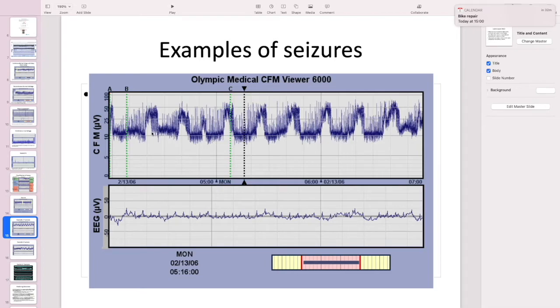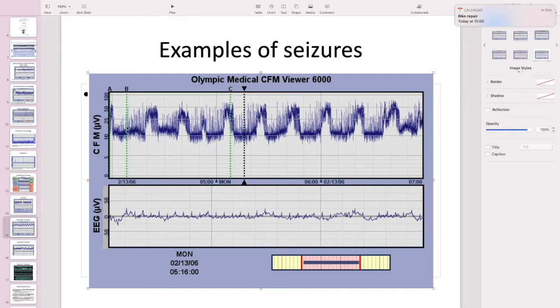So in this infant, the lower borders, yes, well above 5, uppers above 10, looks kind of continuous, narrow, but then these areas of jumping up, high amplitude, and if you looked at that time period where there's high amplitude, you get this regular rhythmical movement, which would suggest seizures.